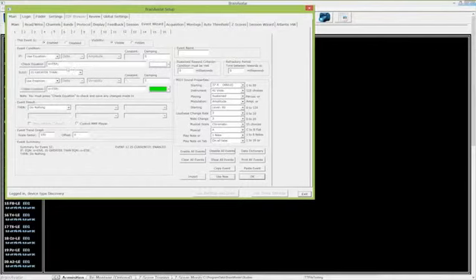But if I'm looking at the A portion and B portion, no matter what's in there is going to be affected here. So once again, that's kind of the difference between a variable and a function. This is more of a function to help prevent me having to do more work in the future. So for what I set up in the third party here, I only set up one function. I said when both are successful, make your thing go.